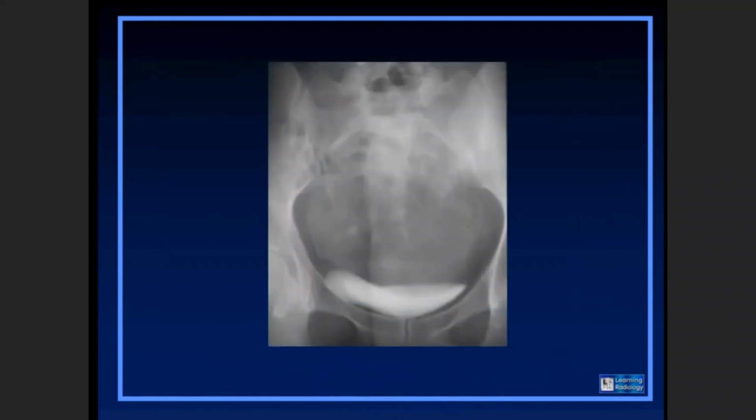Some types are unknown, like for example here, this can be contrast material if the patient has had an IV contrast study, like a CT abdomen with IV contrast, and we image the patient after many hours, we can find the presence of a contrast fluid level.